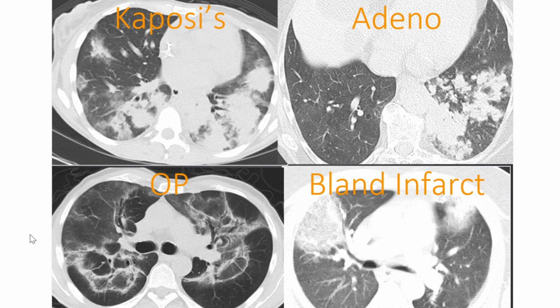Bland infarct. I know all of us were taught in medical school about a wedge-shaped peripheral opacity, but I always quote this paper by the French where they studied 2,000 infarcts, and they actually said that this subtle sort of central ground glass was more specific for an infarct than wedge-shaped or peripheral. So you can think about all the non-contrast chest CTs. If you see this almost reverse halo, but not as clear as this, you can start thinking about what the risk factors for bland infarction are for this patient.